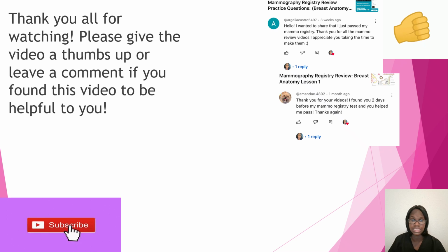I want to just throw in this PenRad video to see if anyone has used it. If you haven't used it, hopefully you can find this video helpful. I wish I could have showed more, but of course, due to HIPAA, there's only certain things that I can show you. You can also view prior images in this PenRad charting system. You can pull over prior images for the radiologist to compare the images to. You can even view the report. So there are other things you can select, also for ultrasound tech too. I just couldn't get to it because of the HIPAA law.